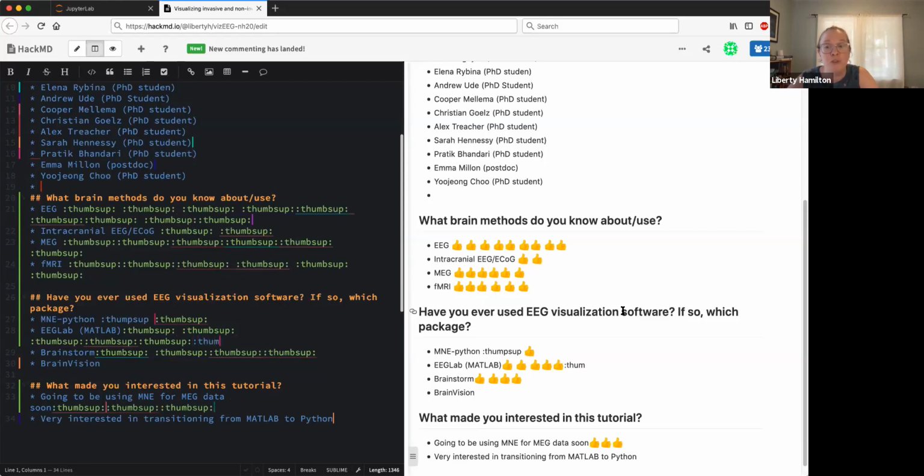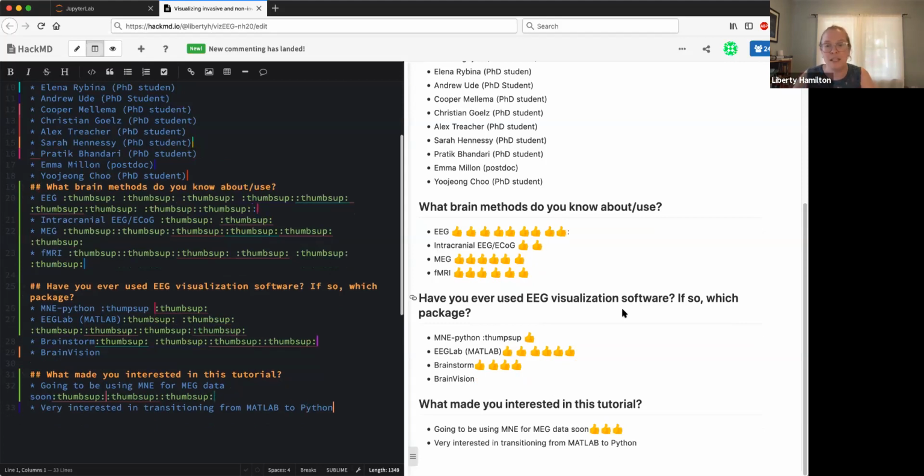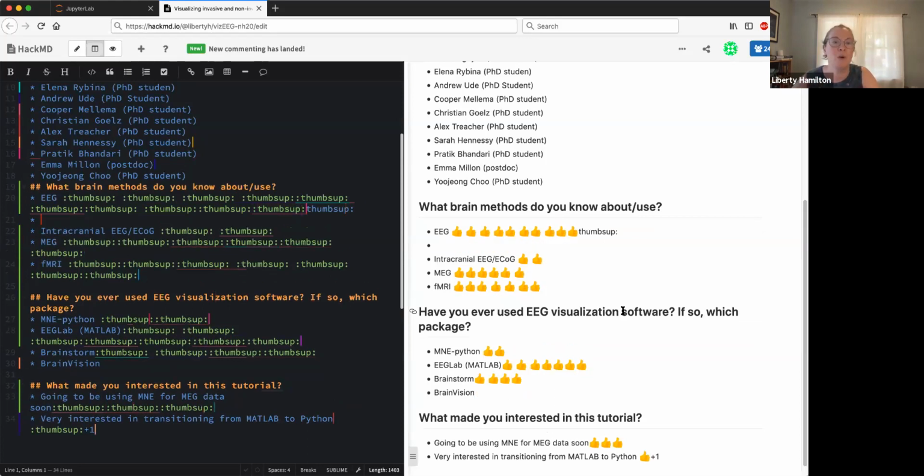And hopefully we'll show you some of the things that you can do with this Python tool that if you have used things like EEGLAB, for example, or some of the Vision Analyzer software, you'll see that some of it is similar. I'm not planning on talking about pre-processing in particular today, but of course, MNE is a fully featured software product.